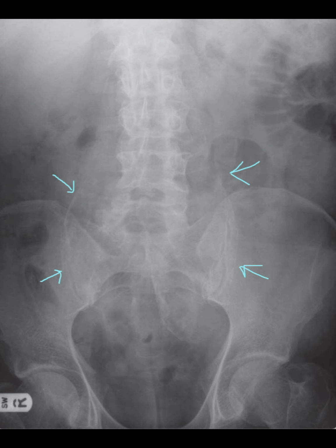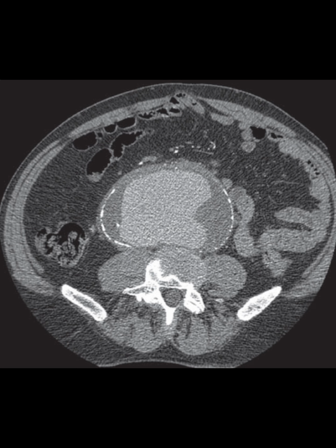This finding could be incidental, but if the patient is experiencing abdominal pain or other symptoms, it's crucial to consider this condition seriously. In my usual practice, when such findings are present, I discuss the case with the referring clinician to arrange further imaging, typically an ultrasound, to confirm the presence and size of the aneurysm. If the aneurysm is large and an intervention might be necessary, a CT scan is typically required to evaluate the suitability of the aneurysm for open or endovascular repair.